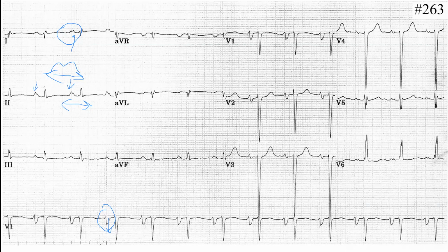I don't know. Anybody? Is it atrial hypertrophy? Which atrium? Right. No. Then left. Yes, the left one. So we do have a left atrial hypertrophy, or this is called P mitrale. Okay, good. Now you can look at the PR interval, and this looks a little bit elongated, as you said. That's okay, because it's starting from here and ending here. Yes, okay, go on.